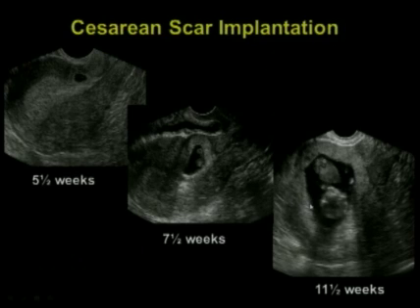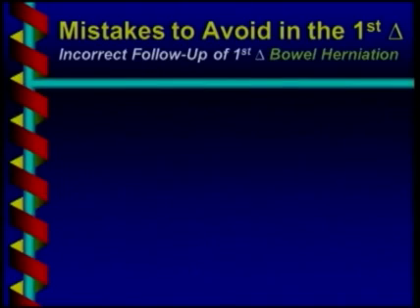She said no, and 4 weeks later you can see now she was having very severe pain, bulging the uterus, and she actually came to require a hysterectomy to save her life at this point, whereas a less invasive treatment earlier would have saved her uterus. So these are important findings to diagnose and consider management early on.